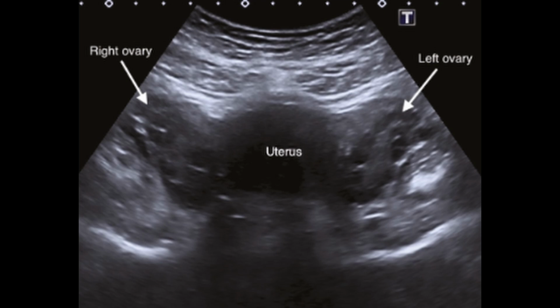If we spot lumps in the wall, those could be fibroids. Basically, your uterus decided to grow some tiny roommates. And if the lining is looking a bit thick, it's like the uterus is wearing a heavy coat, and we need to investigate further, especially for those postmenopausal folks.